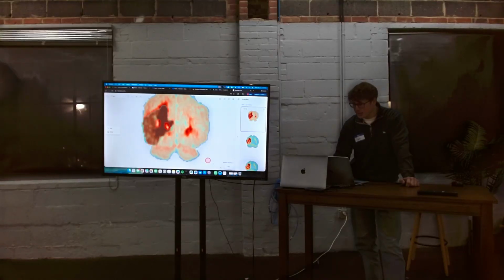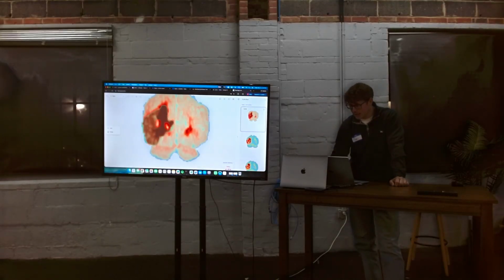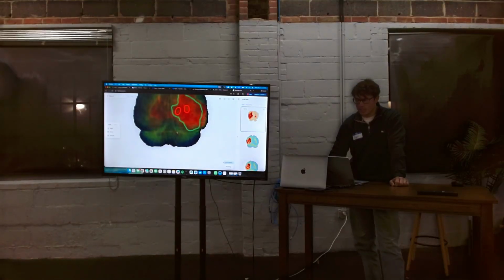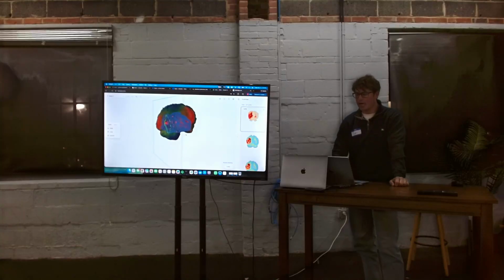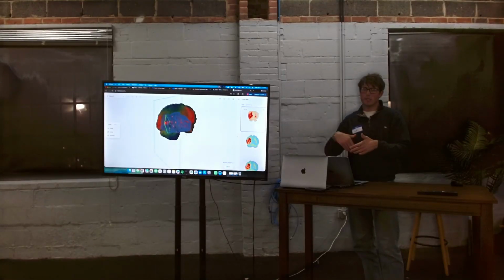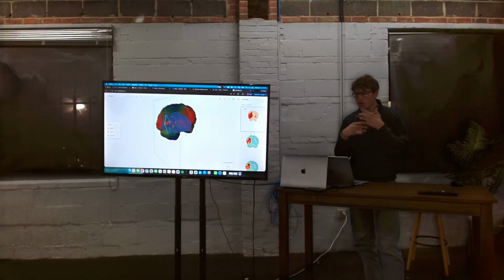And I'll accept this. I'll change it to run for the entire view, the entire group of planes. And then you'll see it from the side. You'll see just one plane right here. But then you'll see it propagated through the entire view. Since there aren't actually multiple frames for each of these planes, you can just see it throughout.